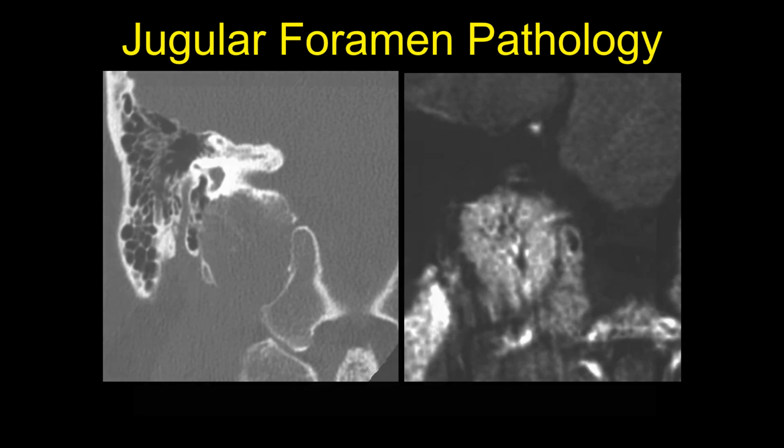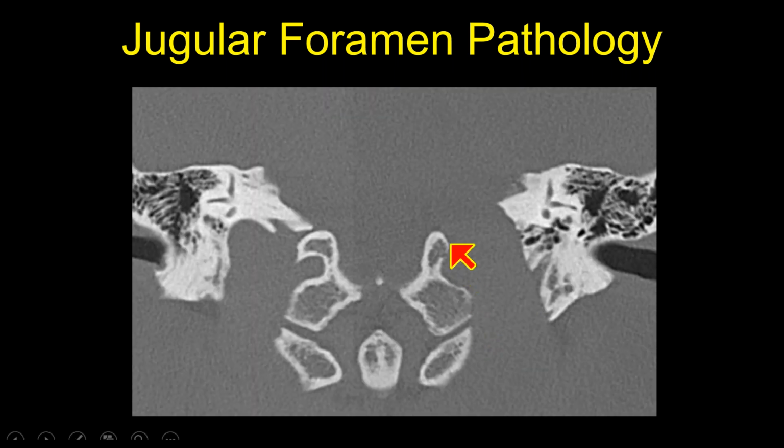Here's another pathology. Here we have smooth scalloped margins. Similarly, we've kind of debeaked the bird. We've cut off the beak, but now we have smooth scalloped, almost surgical margins of the bones at that level. Again, here we see on this CT the nice white line of the cortex of the outside of the bone at that level where the jugular bulb is.